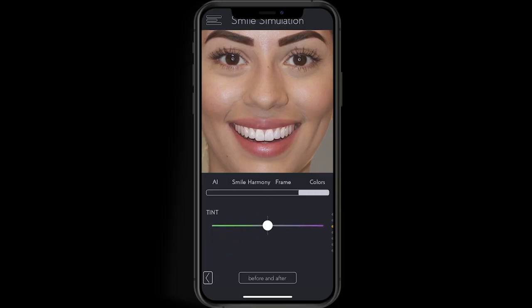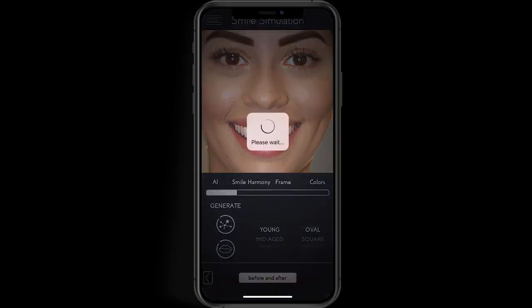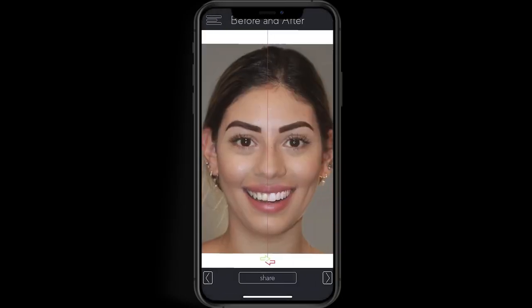The tint option allows you to change the hue of the teeth to be able to cool the colors in the lighter spots of the enamel. In certain cases, you also will need to simulate periodontal procedures where the patient shows the gingiva display when smiling. To do this, use the saturation option to set the saturation of the gum by moving the slider, or change the opacity of it to create the most natural looking simulation.